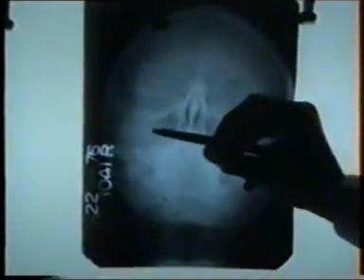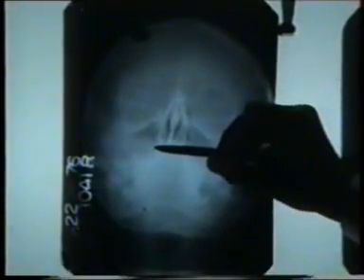And in the last X-ray down over here, we see a maxillary polyp classically showing a convexity pointing upwards in the right maxillary sinus. So this is a right maxillary polyp.